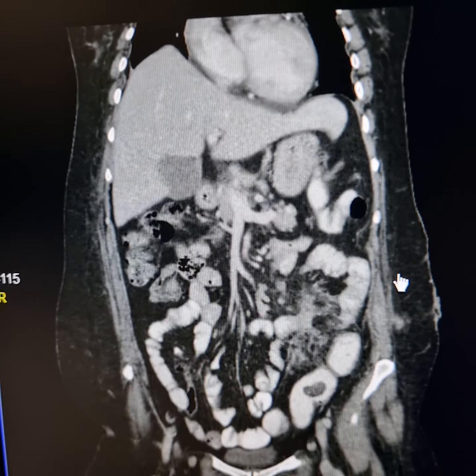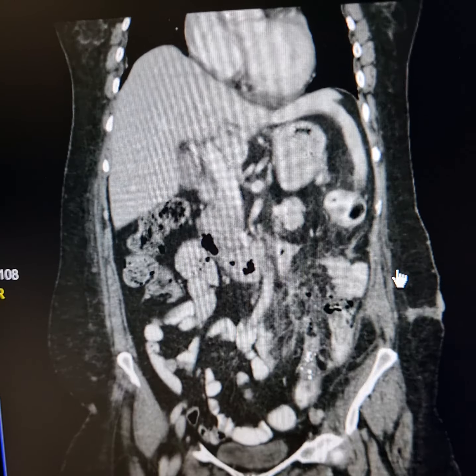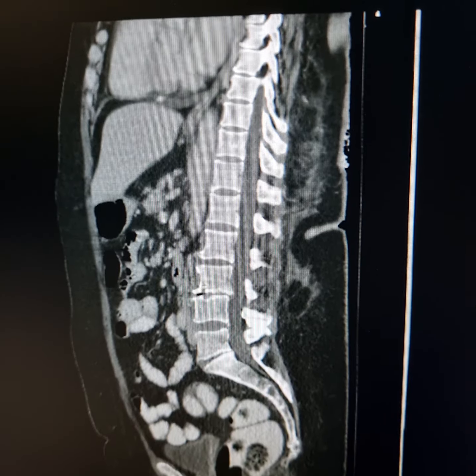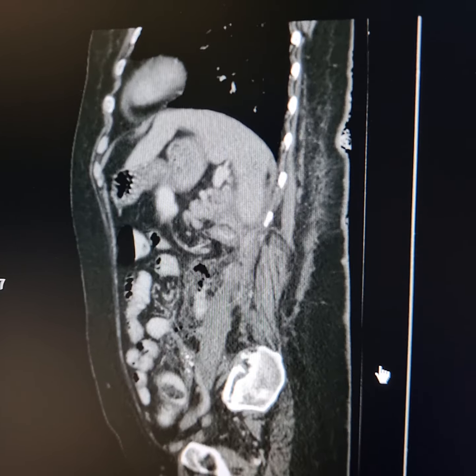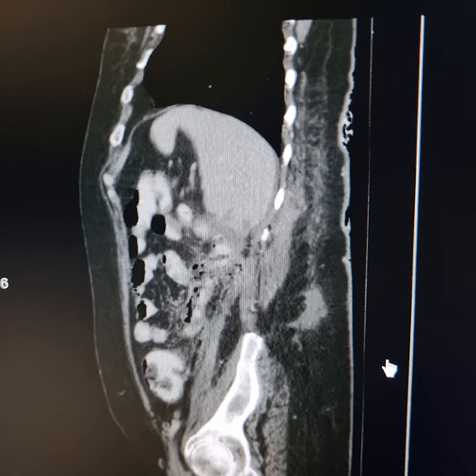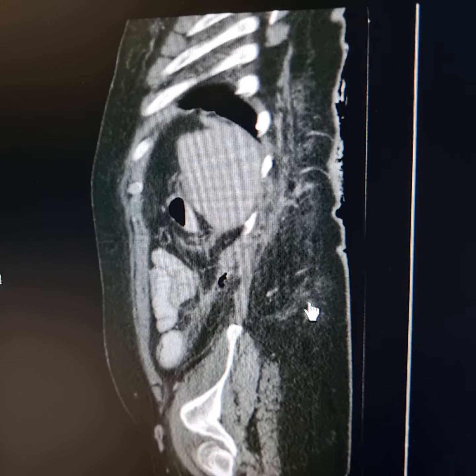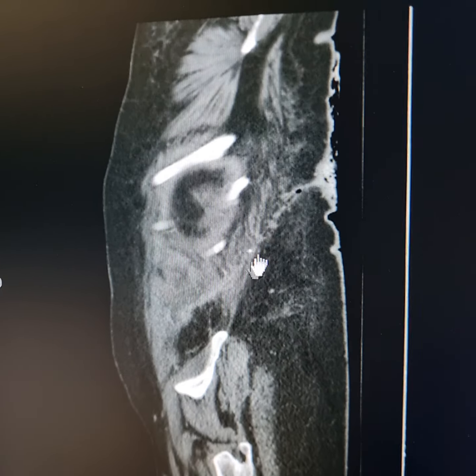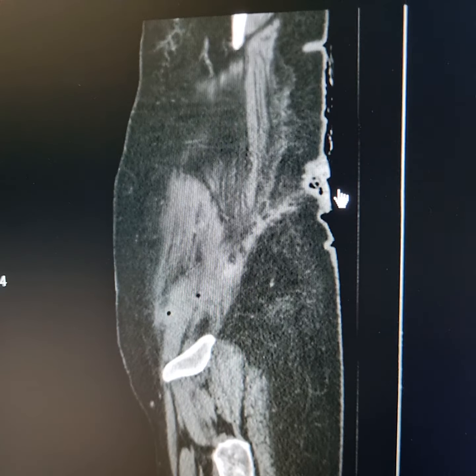On histopathology, the patient was having Xanthogranulomatous pyelonephritis on left side. This is the sagittal scan. Same findings of colocutaneous fistula. The air in the tract leading outside onto the skin and the extravasating contrast medium.